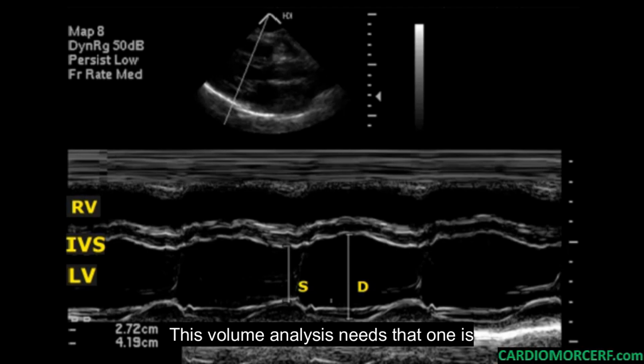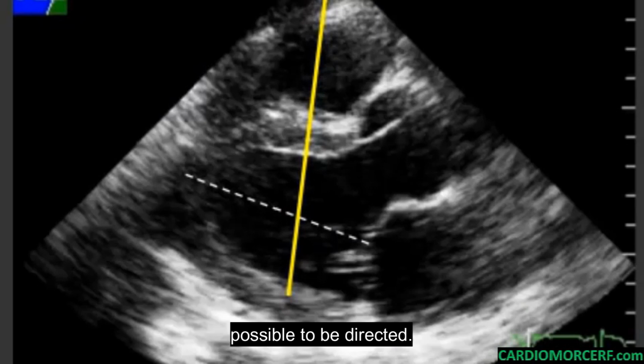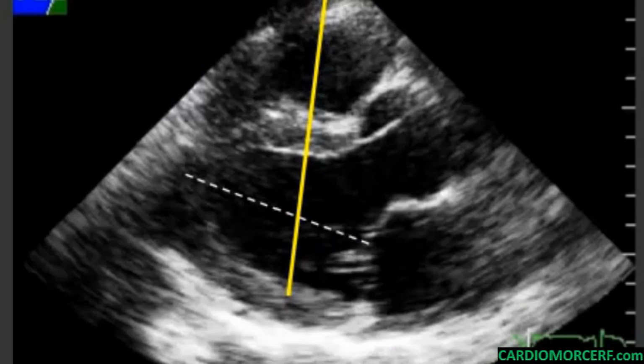This volume analysis needs that one is confident that the M-mode cursor can always be directed as perpendicular as possible to the long axis. Remember this, the short axis by definition is the one perpendicular to the long axis of the left ventricle, obtained at the chords close to the tips of the mitral valve.